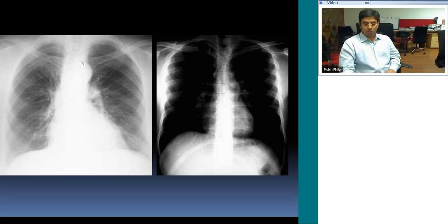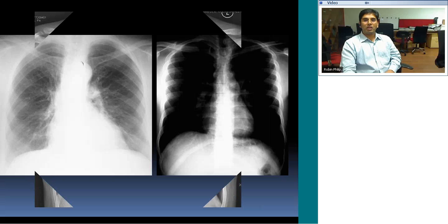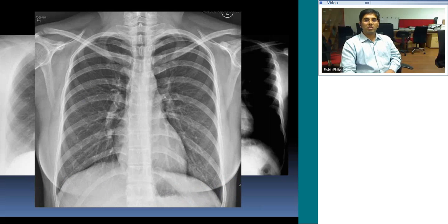So it has to be between these two, depending on the indication. A perfect radiograph should look like this. See how beautiful it looks with everything being displayed. You can see the lung markings very well. You can see all the rib cage, diaphragms, everything fantastically depicted. And here the centering is about the patient.